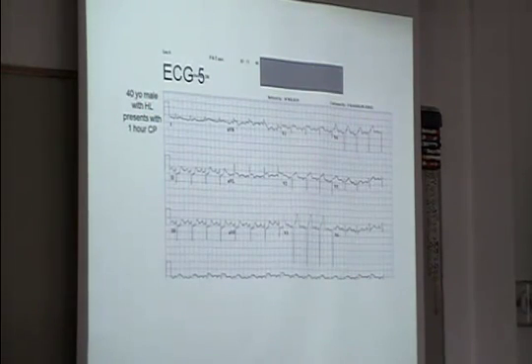So this 40-year-old man with high cholesterol presents with 1 hour of chest pain. And so here again, we see ST elevation in aVL, which is a high lateral lead, maybe a trace here, maybe not diagnostic here. You see that depression, a reciprocal opposite kind of effect inferiorly. You also see some ST depression. This would qualify as an ST elevation MI here, the right precordial leads.